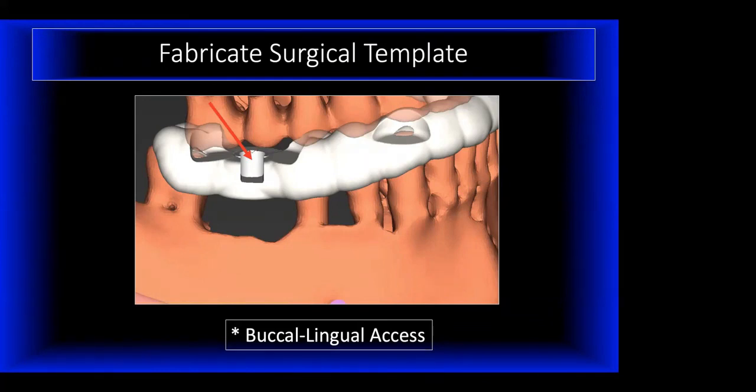Again, 3DX makes them this way, but you have to ask for it. What they do is leave the buccal or the lingual side of the tube open. The tube, which prevents any misalignment of the drill, is about 5 millimeters in height. They just take out the buccal or the lingual, so you actually slide the drill in from a buccal or lingual access.